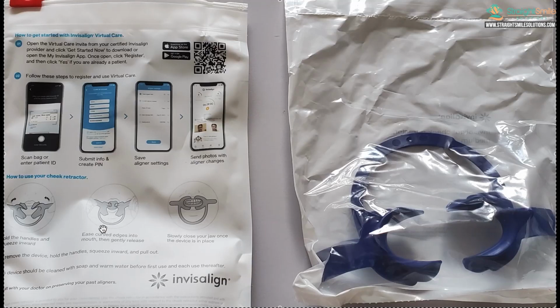And it doesn't just have to be for Invisalign. It could be for any aligner company. It could be for elastic wear with braces. It could be for expander turns. It could be for functional appliances. It could be for retention. Could just be for alignment. Could just be to check if there's breakage on braces. I mean, I can think of a bazillion different ways you could do it.